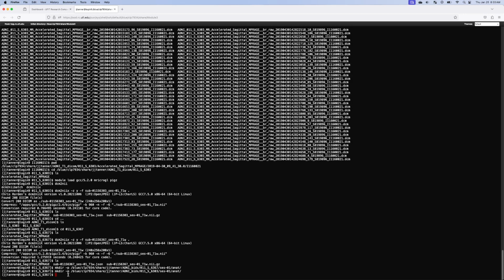Now, what we want to do is, I'm in the 6367, so I want to move. You could copy. I'm going to be daring, if you will, and just move these files. Again, I would recommend copying, so cp instead of mv, but I've done this before, so I'm going to move the files, and I'm going to do this in one command.